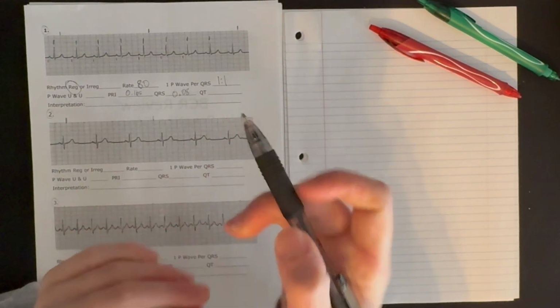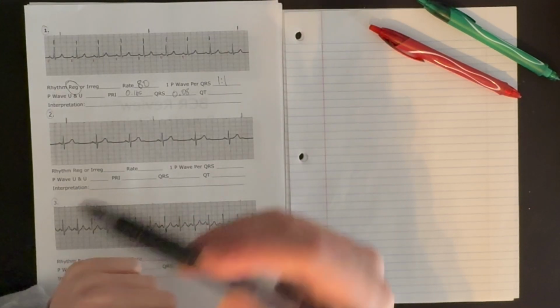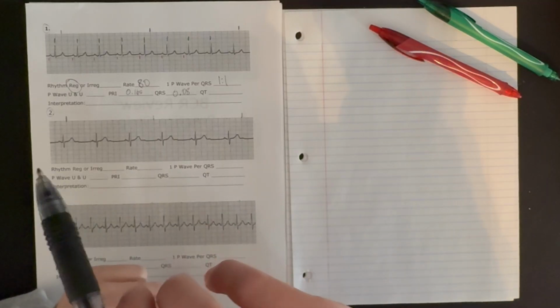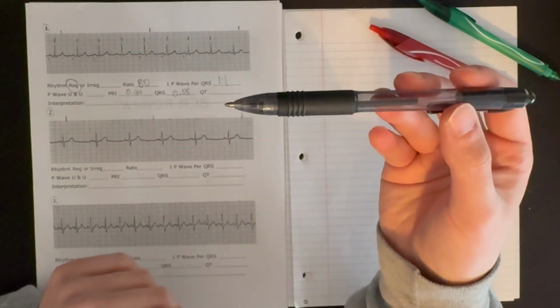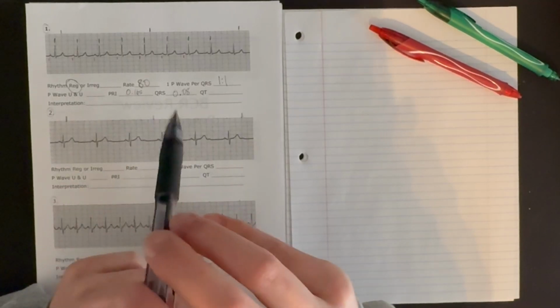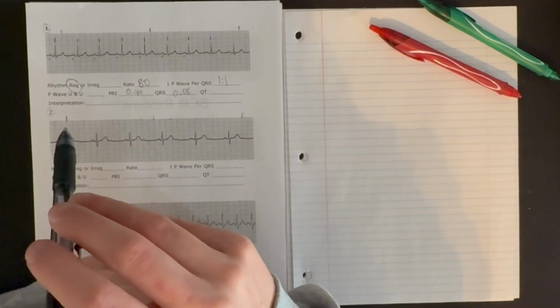What does that tell us? That tells us that the signal that is going through the ventricles and depolarizing them is following the conductive pathways. And that is why it is able to get through the ventricles so quickly, right? That tells us that it has to be coming from above the ventricles, either in the junction area, which is the AV node and bundle of His, the atria, or the SA node.